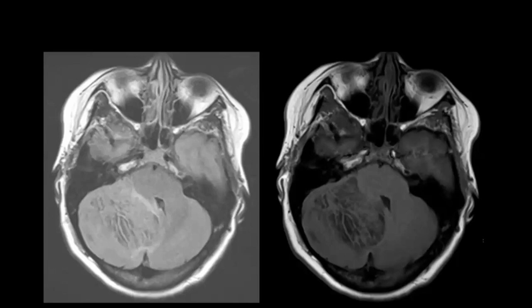Okay, sir, it is an intra-axial cerebellar mass in an adult patient. So my differential will be, okay, it can be any cystic tumor like medulloblastoma, cystic astrocytoma. As far as the cystic is concerned, you see here the FLAIR. Yes, sir, it's not suppressing here, and here is the T1, and I don't see fluid signal here. So it is not a cystic lesion.